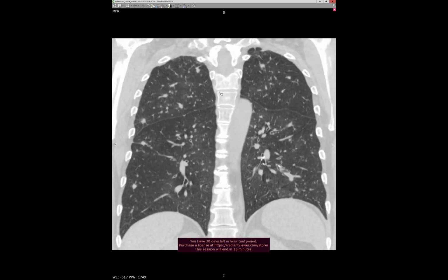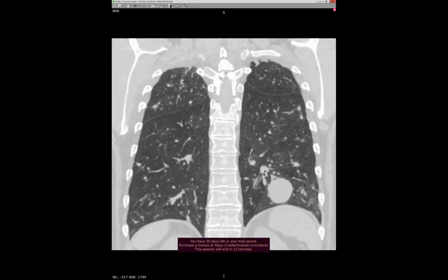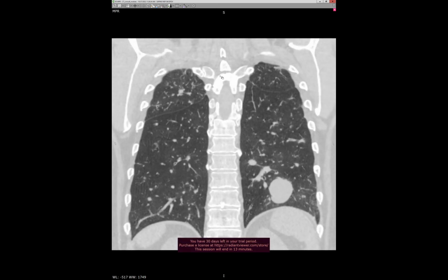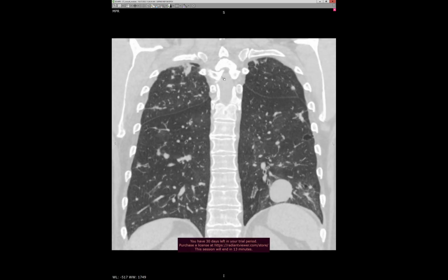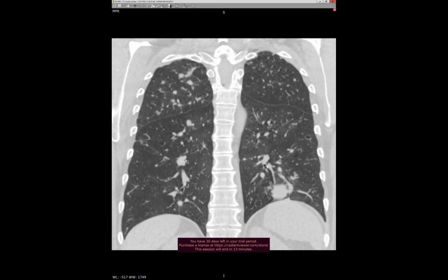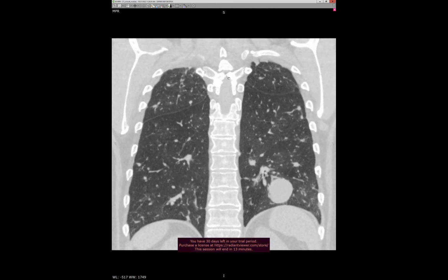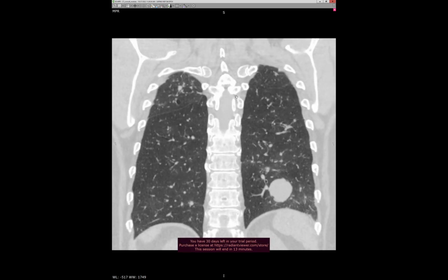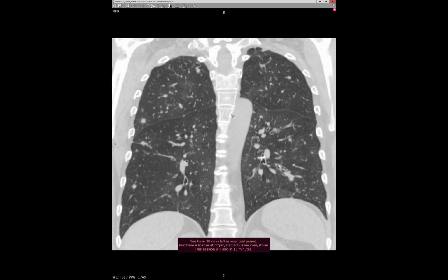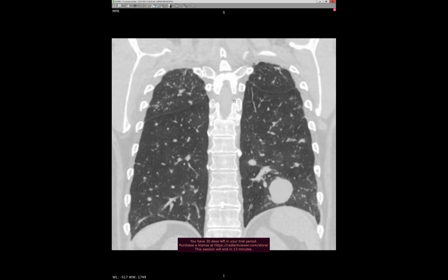Jeff has shown a few cases of MALT lymphomas lately. This wouldn't be a bad pattern for some sort of lymphocyte infiltration of the lung. Jeff brought up, and it popped to my mind, lymphomatoid granulomatosis, but those nodules are usually much more bizarre, ugly looking. He talked about, and I agree, some sort of lymphoma, lymphomatous process.